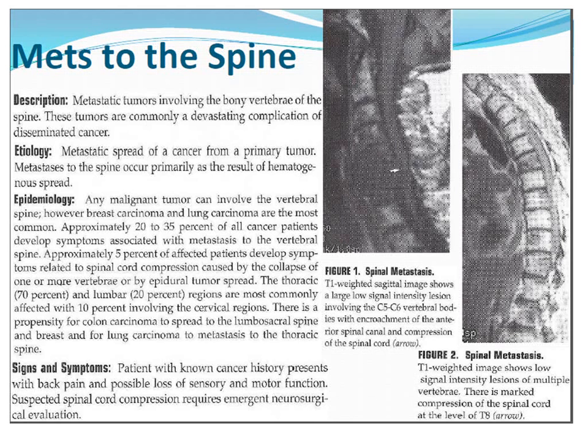If you were to see some metastatic disease on the spine as you're scanning, one thing you'd want to call a radiologist about, to get things moving, is if you see something like this, where this is a big lesion of the vertebral body, it's expanding posteriorly, and it's really compressing the spinal canal and the cord a lot there. We're not seeing any definite signs of cord edema, but the sooner that you decompress the cord, as far as mass effect on it, the better the patient's going to do neurologically.